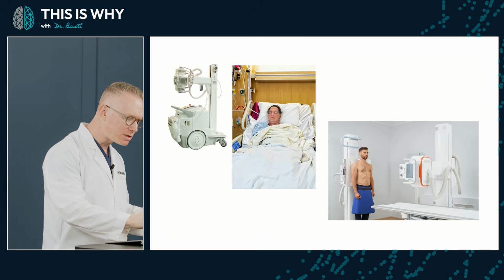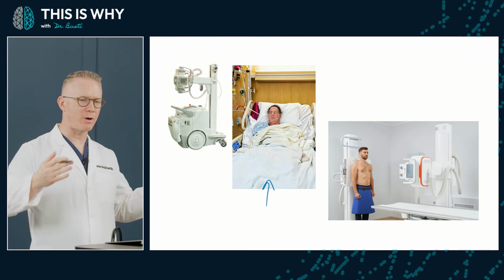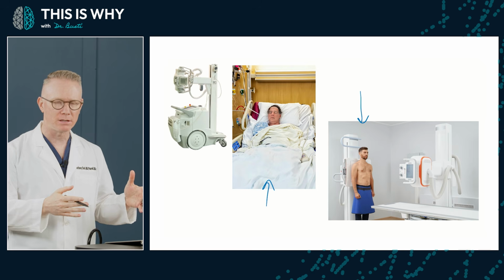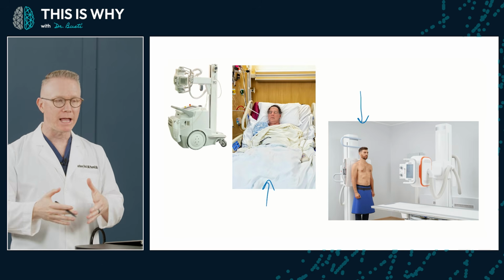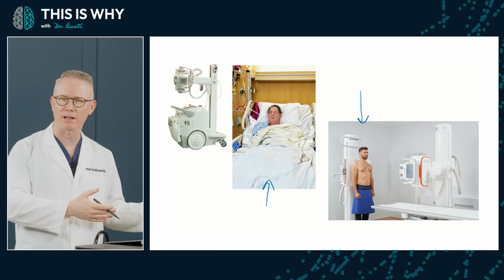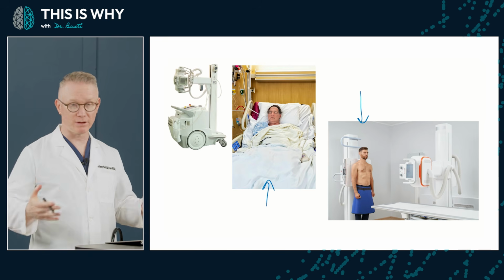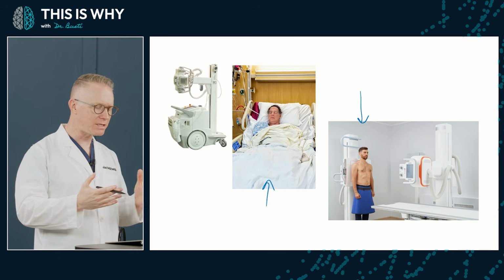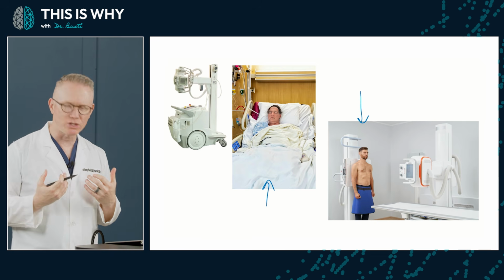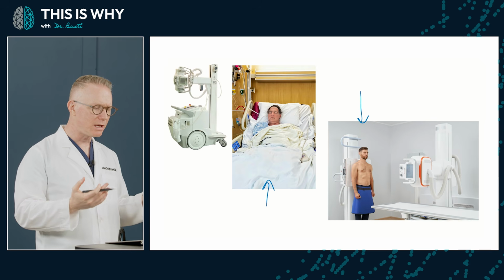If you look at this patient here, you can see that they're not standing upright and have their arms laying out to their side, unlike this patient who is able to ambulate into the radiology department and participate potentially more than a normal, otherwise healthy patient in a hospital who's sick. Right? That includes following basic commands, having the strength to move their arms, even to stand up. Okay? All of these things influence the type of position that the patient can be in and the image that we're acquiring, which influences our overall interpretation, assuming that's even a good image to begin with.